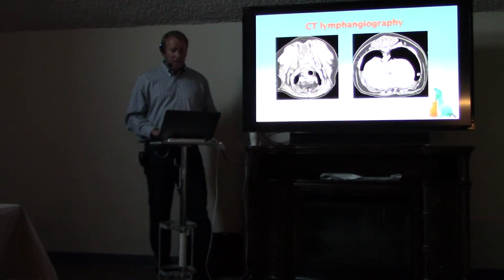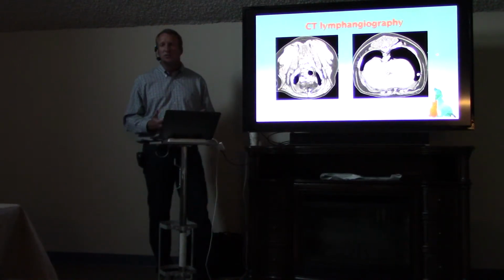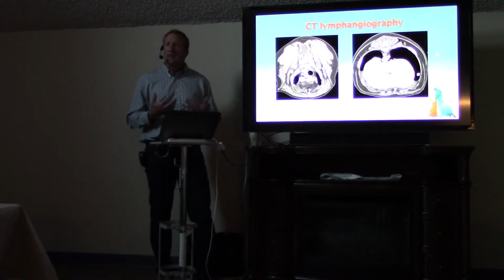We did do another scan post-surgery, and there was some contrast up in the craniomediastinum again, not as much as before, but when we went back to the surgical site, we can see that one of those ducts was not ligated, and so it was kind of unfortunate for the surgeon. Had to go back in and find that duct and ligate it, but it's better than having a poor outcome and an unhappy client.